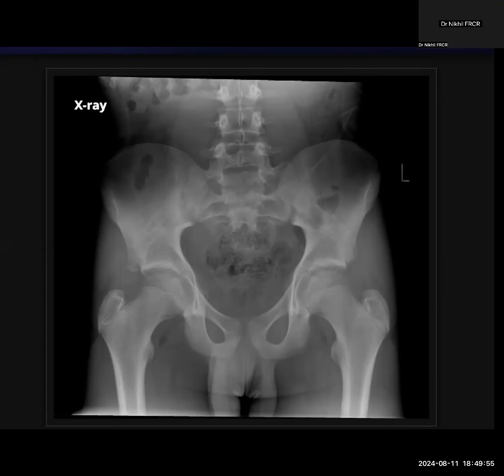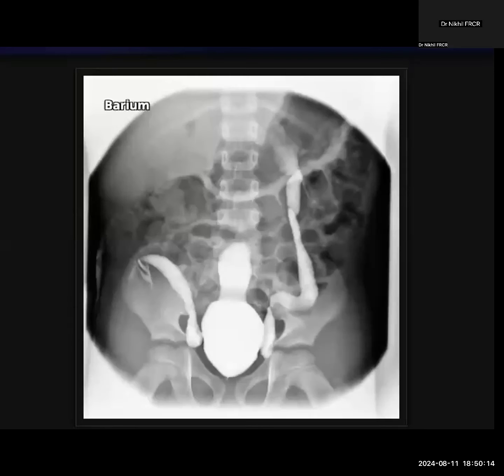So the orthopedician or the physician is asking you which muscle is involved. What would you think of? Rectus femoris. Okay, great. So this is your next case.